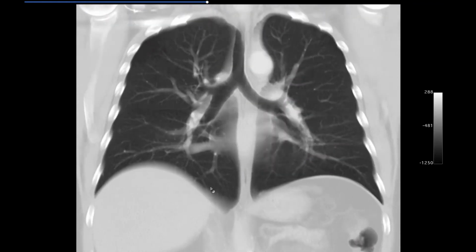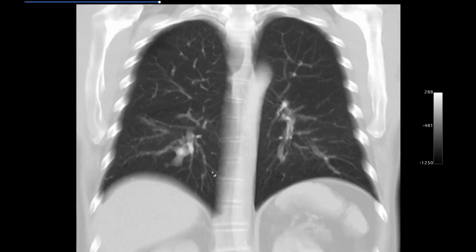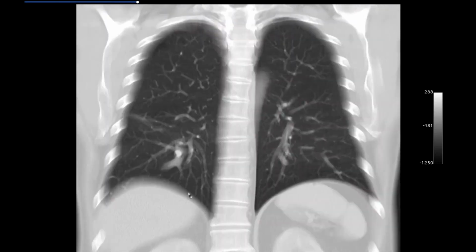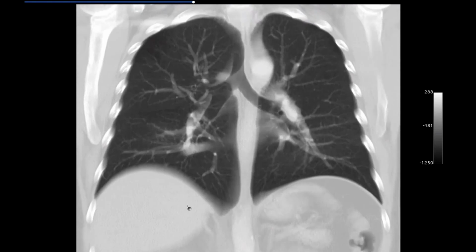And I think we've shown quite a few of these at this conference, and this is one of the more impressive ones that I've seen. I don't see communications between this one and any others in the form of arcades that we've shown before, but just a nice example of that. So it's a big fat vein with a funny course, but it only connects to one end. Is that what you're saying?